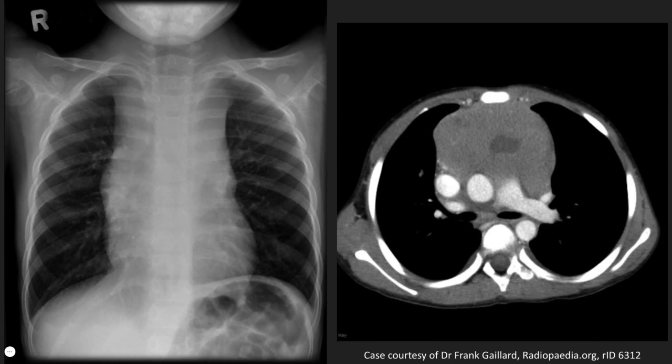The other important consideration is the mediastinum. It is essential that we do not miss a mediastinal mass in a child, or anyone for that matter. This chest X-ray shows widening of the mediastinum. There is no loss of the branching structure of the hilum, something we refer to as the hilum overlay sign, which localizes the mass to the anterior or posterior mediastinum. There is no loss of the paraspinal lines, further localizing this lesion to the anterior mediastinum, as confirmed on CT, which shows a heterogeneous anterior mediastinal mass. This turned out to be lymphoma.